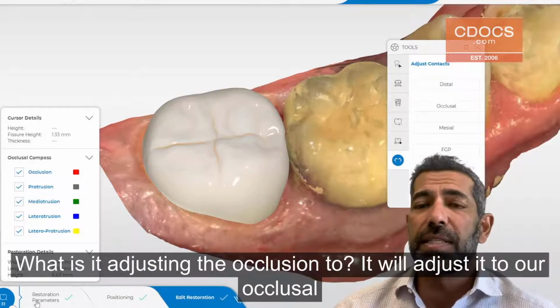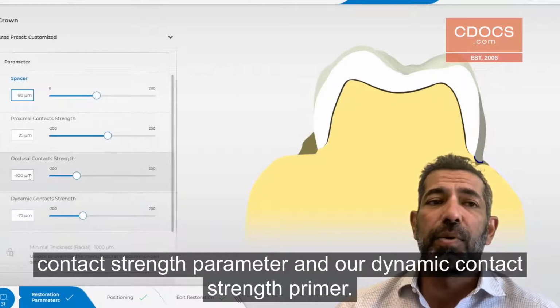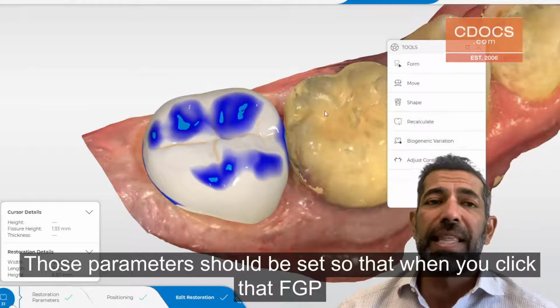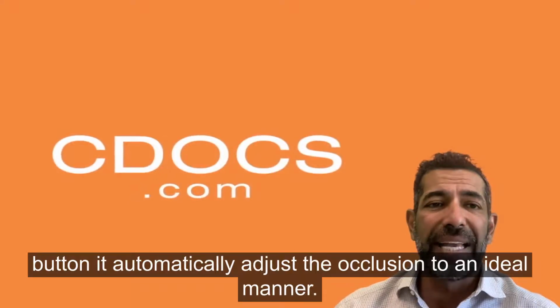Well, what is it adjusting the occlusion to? It will adjust it to our occlusal contact strength parameter and our dynamic contact strength parameter. Those parameters should be set so that when you click that FGP button, it automatically adjusts the occlusion to an ideal manner.